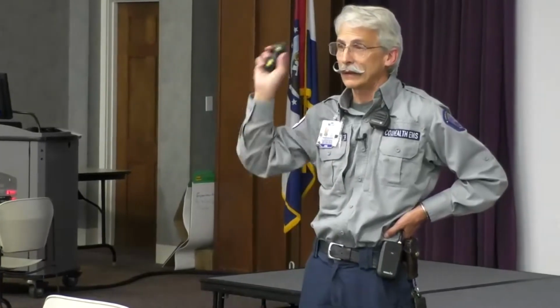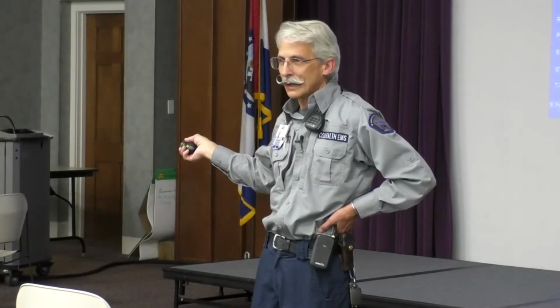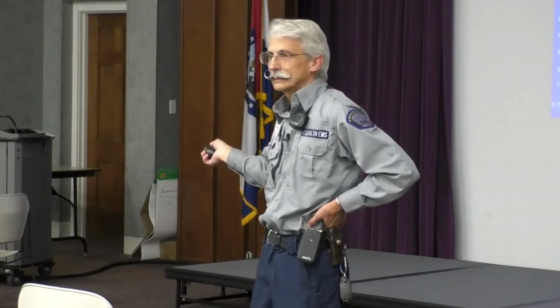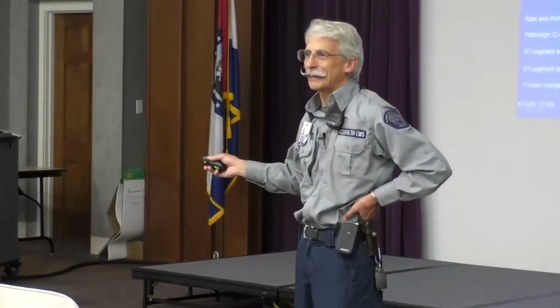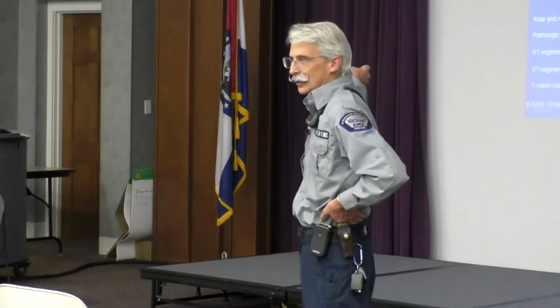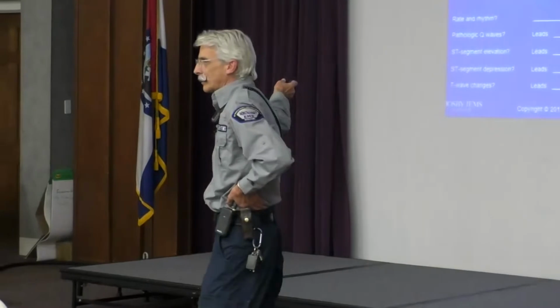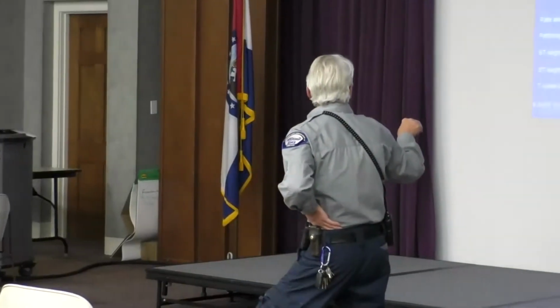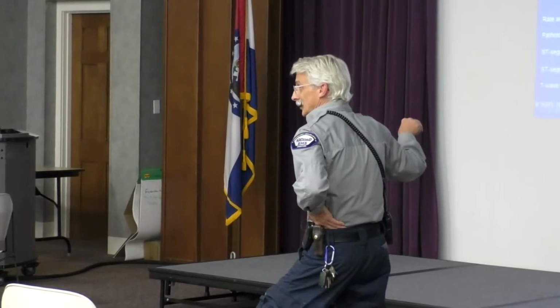Well, I have the inferior. I know I have an inferior. Do I really care if there's a posterior now? Maybe not, right? I really don't. So you can spend some time thinking about that, but I'm not going to worry about it. What do I want to do with this 12 lead though? 2, 3, and AVF are elevated. Tell me what part of the heart that is. Oh, wait a minute. There's cheaters down here. Okay. See 2, 3, and AVF?